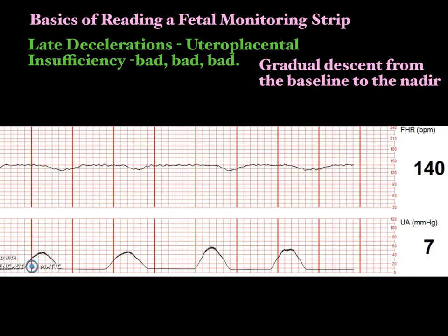And sometimes people are real reluctant because they know that lates are an ominous sign. They will call something a variable when it's really a late, and we can all look at it and agree that it's a late. But they'll call it a variable with a late component. The new NICHD terminology really did away with that. You have to make a call. It's one or the other.